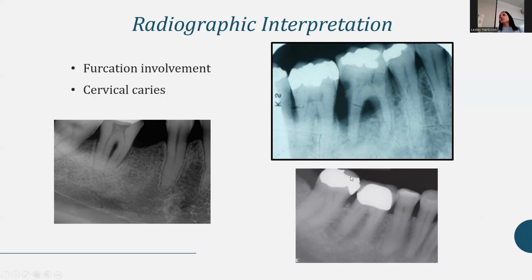Again, just some furcation involvement. There's caries on this one. This is just showing different examples. Notice how you see the lamina dura here, but there's no lamina dura interproximal here. You don't hardly see any lamina dura anywhere on these. They're also kind of lighter films as well.